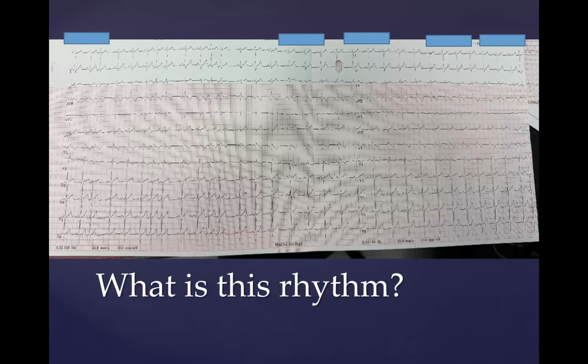I think because you do see. You're right, by the way. I'm just asking you how you would know it's not that. Because in multifocal atrial tachycardia, the P waves look similar to the intrinsic sinus P wave. No. What happens in multifocal? What does it mean when it says multifocal? That there's more than one or two different P wave morphologies. Yeah, exactly. There are multiple P-wave morphologies.